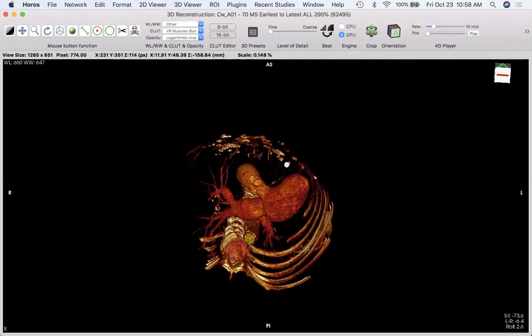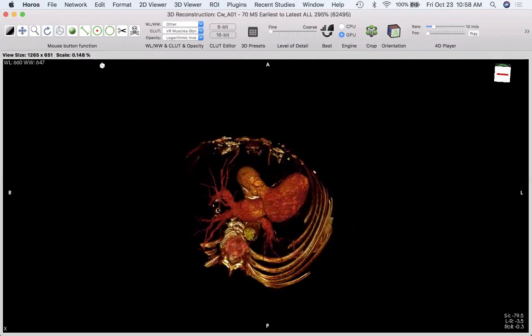And so if you want to look in at just the heart, you can then take these scissors and essentially left button down and then just drag the mouse around like this. And now everything inside this sort of cone or cylinder or irregular cylinder, if I hit enter or return, it'll keep everything inside.